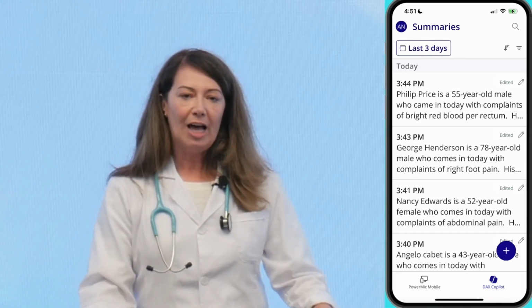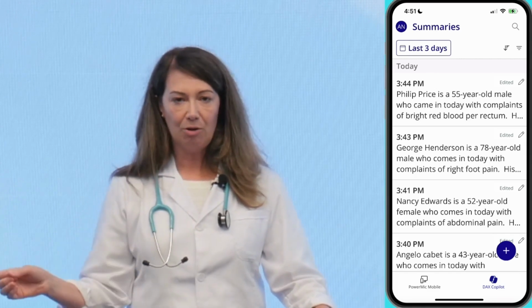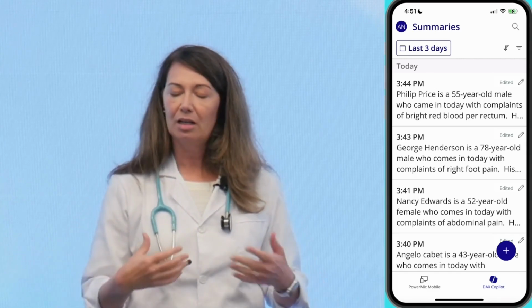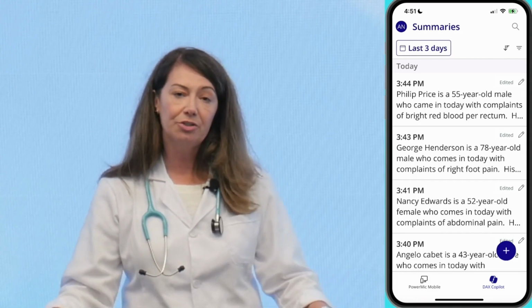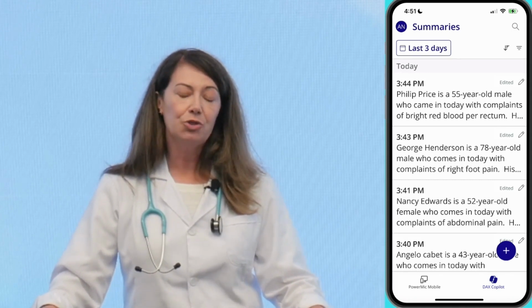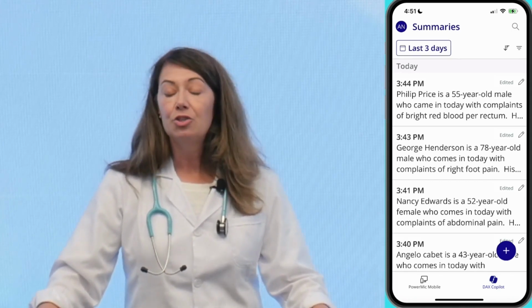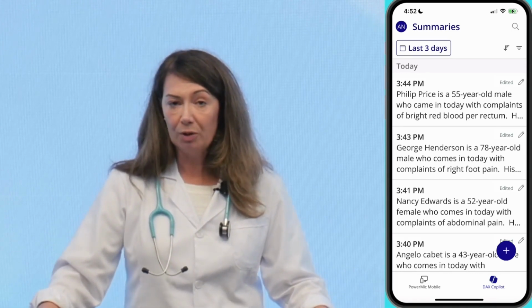Now, also on the mobile app you can see a list of summaries. So these are all of the encounters that I've completed today. A scheduling feed is not required to use DAX Copilot, and so we would simply recommend that the clinician use two patient identifiers such as name, age, date of birth, or gender to be able to identify the recording.